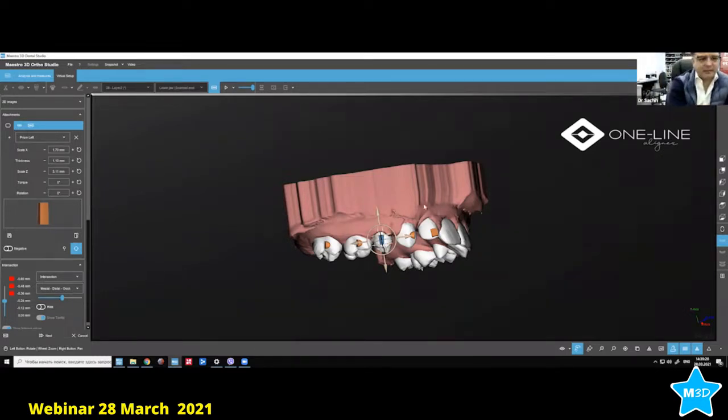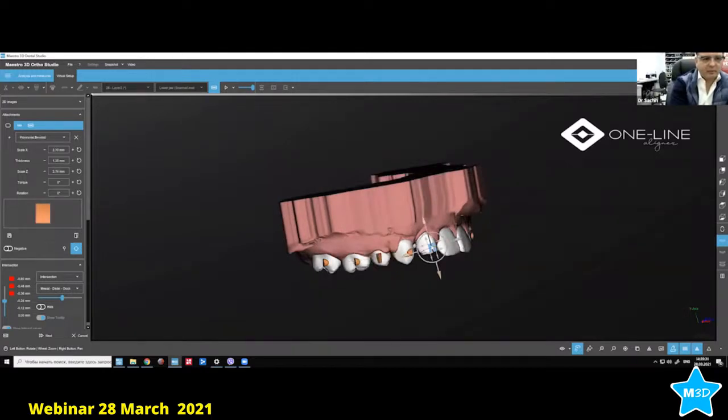So let's say the same tooth. Sometimes you are replacing the attachments? Sometimes, not all the time. Normally what I do is I see the final outcome, and I use something which is in the middle. As I said, for this lateral, I can do only rotation in the beginning, and later on I can do the extrusion. But I'm doing extrusion with rotation, with the attachment modified and the position modified.